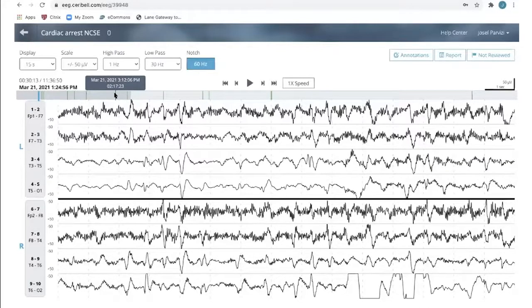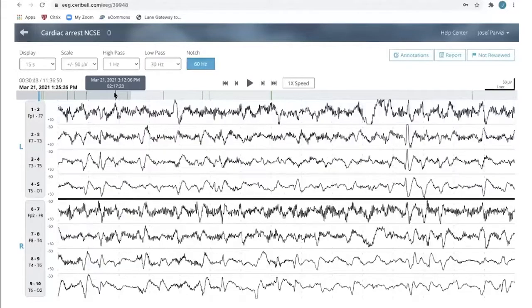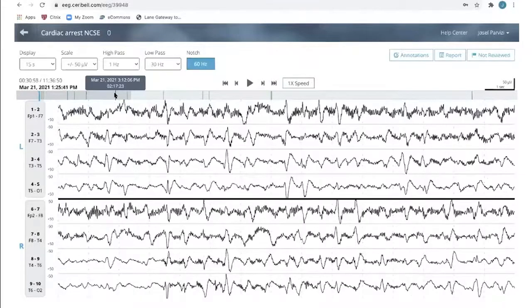In contrast, a person who has severe anoxic injury may have discharges that are less frequent, but also much more regular. They don't change as much. In some ways, the fluctuation shows normal ongoing brain activity. It's brain activity manifesting the seizure, because you need some normal function for a seizure to occur, but also normal in the sense that it's suppressing the seizure.